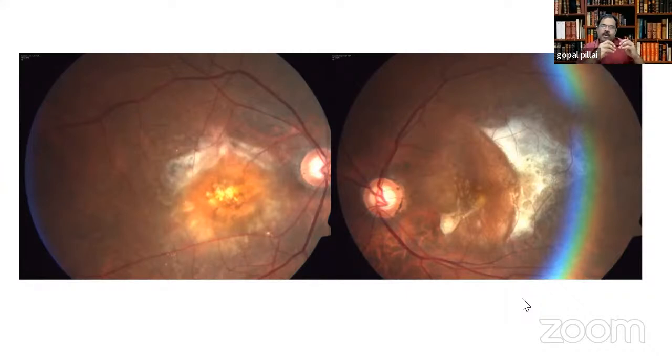Disciform scar occurs only after it bleeds. And when it bleeds and then it scars, then it typically forms a disciform scar. Here you can see that the central area is still central, the left eye, the central retina, most of the retina is looking viable. And temporal most extreme, there is a scar definitely. Probably there was a subretinal bleed or an RPE rip, which must have caused a very regular curvilinear opening like that. Okay, now come to the OCT.